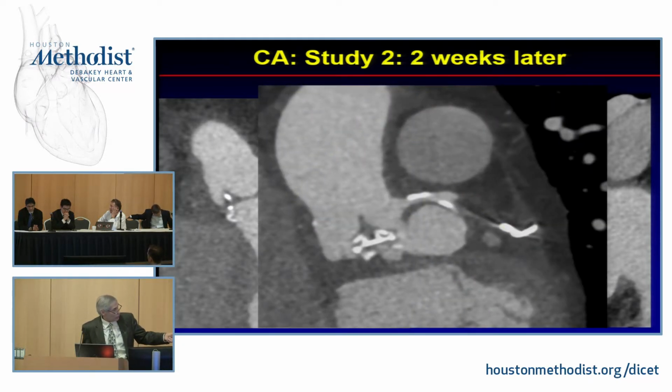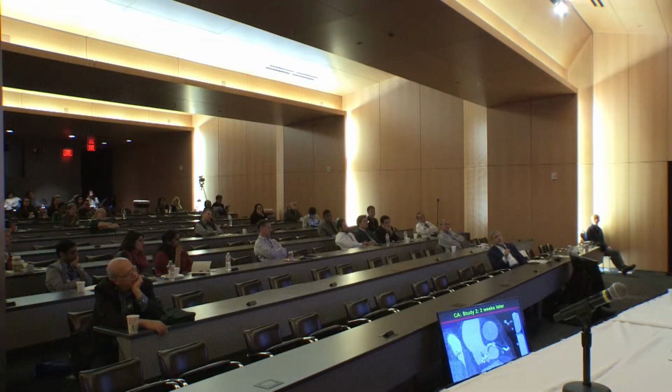And if you look at this, I tried to get it as best I could, you can see this is the hole around, this is a paravalvular leak, this is the abscess, this is into the LVOT, and this is the left main. You remember the case that Dr. Restrepo showed the first day? That's pretty much your CT angio correlate of a rupture in the LV outflow tract just below the valve with a sac, a pseudoaneurysm sac that has opened.